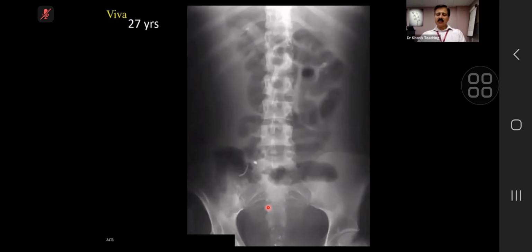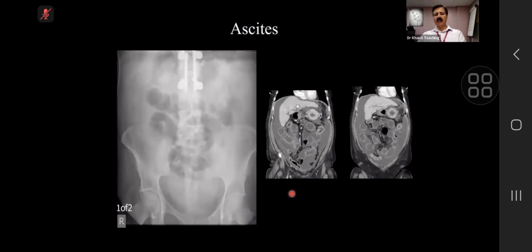Yeah. This is ascites. Now, this kind of ascites has come in the exam. I remember there was a long case actually, which came, I think, 2 years, 3 years ago. It was a baby gram. And on that, one of the key findings was this. Sometimes what happens in ascites is that because there is too much fluid, the small bowel loops which are gas filled float centrally. And this is the picture which you get, floating small bowel centrally.